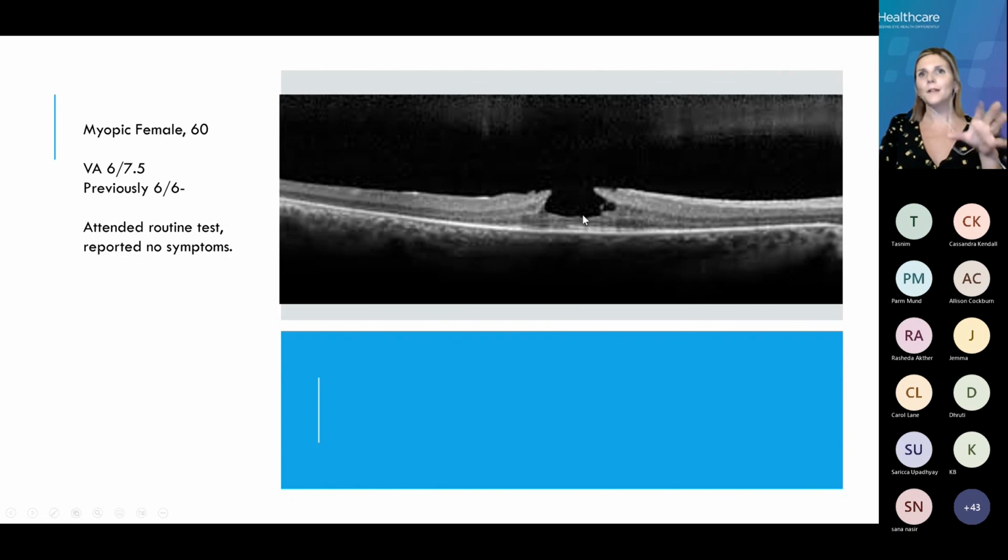Now we would still monitor that patient and we'd still want to use OCT, but because the vision is still good, the likelihood is, obviously, as you know, nothing would be done with this patient. So yes, they've got a lamellar hole, but the posterior hyaloid has gone. There isn't any sign of ERM. So with this, this is probably how they would stay, and we can use our OCT to monitor that.